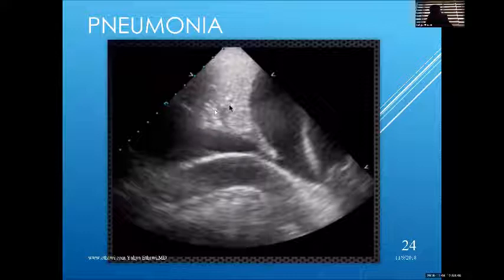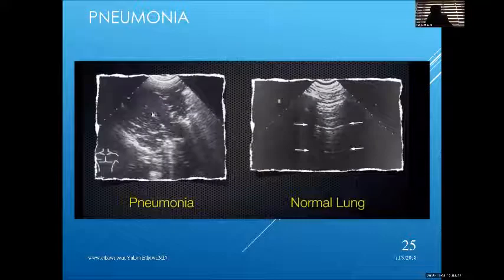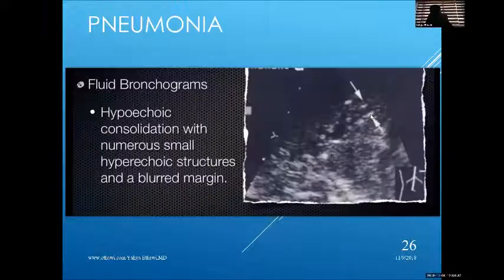You can see here there is a hypoechoic area with hyperechoic lung tissue with hyperechoic air bronchogram surrounded by some fluid. So there is pneumonia with pleural effusion. Normal lung: A lines and B lines. Abnormal hypoechoic lung tissue with air bronchogram surrounded by normal lung tissue. Air bronchogram: coarse, horizontal, non-parallel, hyperechoic, in contrast with hypoechoic lung tissue.